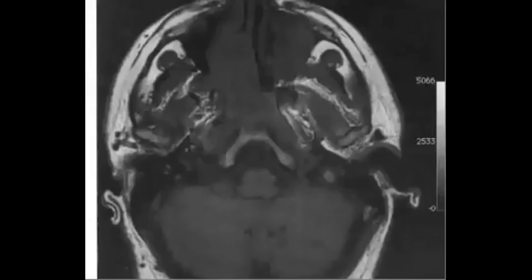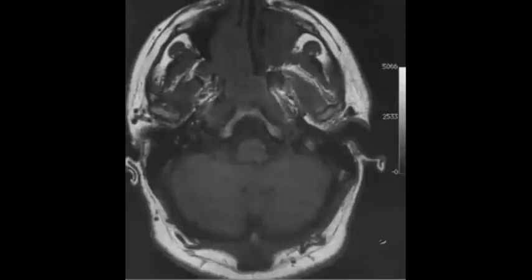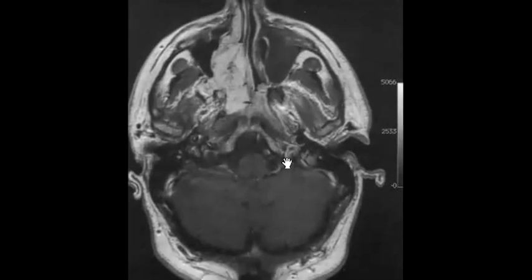This patient did an MRI. You can see in the T1 how it looks, and the T2, sorry, looks like T1 again. So in T1 it is low signal, and in T1 with contrast, you can see post contrast enhancement, intense enhancement.